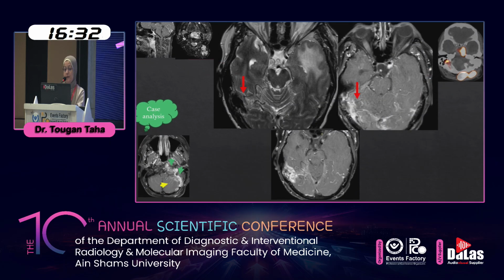On the contralateral side, the transverse sinus is congested with multiple venous collaterals surrounded with edema, and there is bilateral posterior cerebral hemisphere leptomeningeal enhancement. In the left temporal lobe, there is vasogenic edema in T2, no underlying contrast enhancement, and no gallium dotatate uptake.